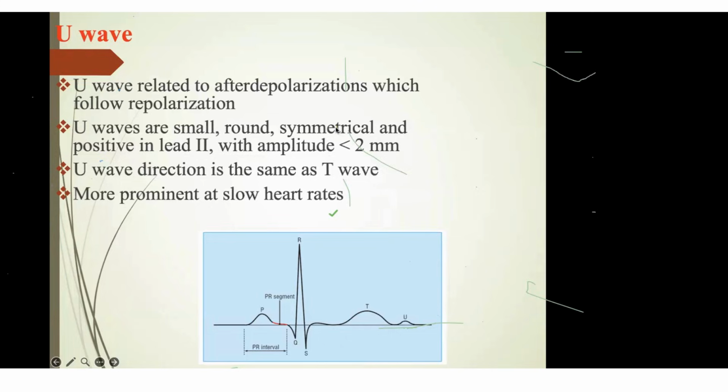In transmural infarction, you will have Q waves and persistent T wave inversions. Then poor R-wave progression. Then altogether findings with left axis deviation in some cases and like that. Poor R-wave progression, I think I told.